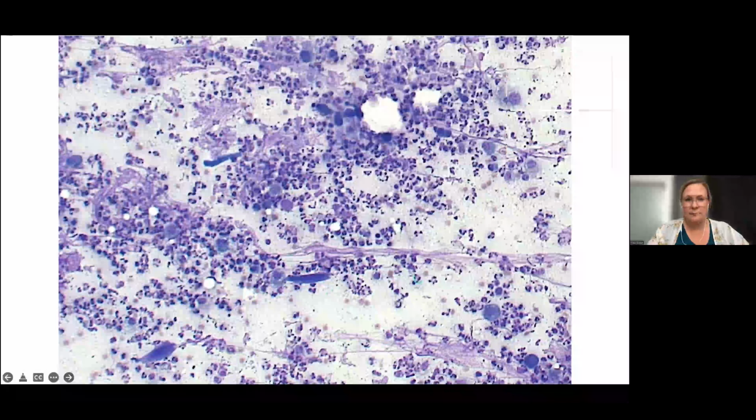There are these big groups of tons of inflammatory cells, which are mostly neutrophils with some macrophages in there as well. Again, next slide, we're going to get closer, but I do want you to notice that there is all this streaming material as well that you'll notice in several of these photos. Those are lysed cells. Those cells have ruptured and all of that content is just the nuclear debris. So you've got to ignore it.